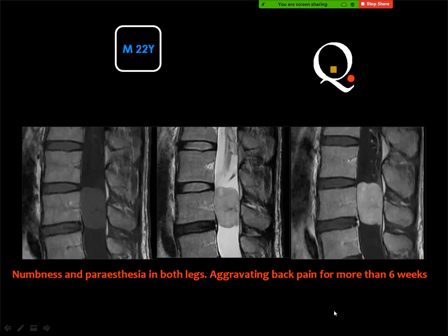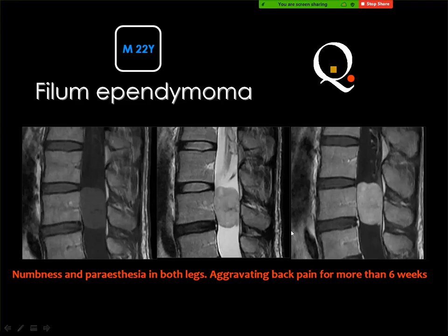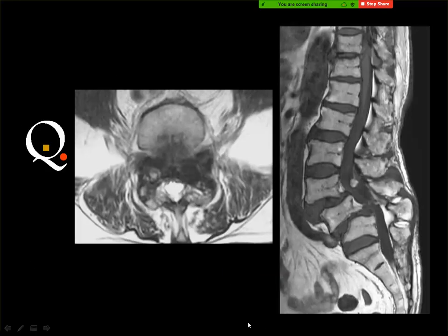Neurofibroma. Okay. Meningioma. Yes, in the differential diagnosis we have mentioned before. Because this lesion is not heterogeneously enhancing, you can exclude the possibility of neurofibroma somewhat, but because of its intimate relation to the filum terminale and the conus, you may think of filum ependymoma. But many times you provide only the differential diagnosis of a meningioma, neurofibroma, schwannoma, and myxopapillary ependymoma. Next case.